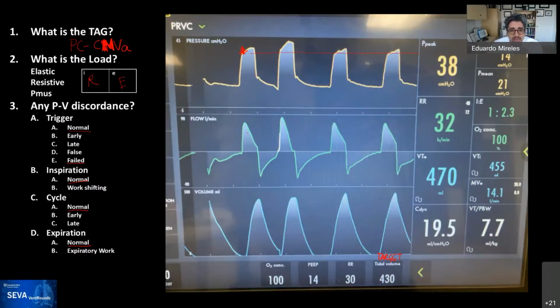And so let's talk a little bit about this because I had some trouble reading this, and I want to hear the thought process of the team. But you would agree with me that this does not decay exponentially, right? This one perhaps a little bit, but it has a little bit of a Humpty Dumpty there. It's not the best, most beautiful decay that we have seen, and actually this is CMV, so we have different end expiratory flows for each one of them because what we said is the I time.